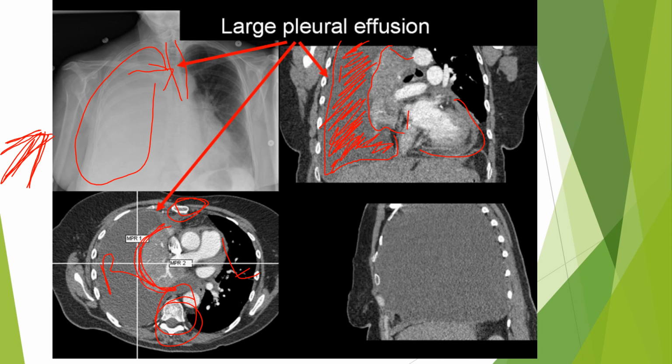You guys see this? That lower left picture I'm trying to outline here. And so all this stuff in here, it's just massive pleural effusion. And then this is the side picture here. Remember the spine is back here. The sternum is up here, so the patient's face that direction. And then all this stuff that's in here is just massive pleural effusion. So massive right-sided pleural effusion, which is more common because, why? Remember, there's less lymph tissue on your right side than your left side.